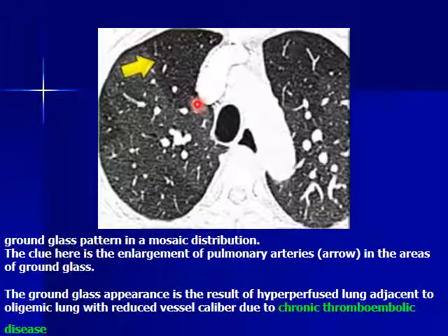Number 2, again, let us make the same exercise. This is an area of low density or dark, and this is an area of increased density. If the vessels in the dark area are sparse, smaller, and less in number compared to this area, it will mean that this black area is the pathological one.